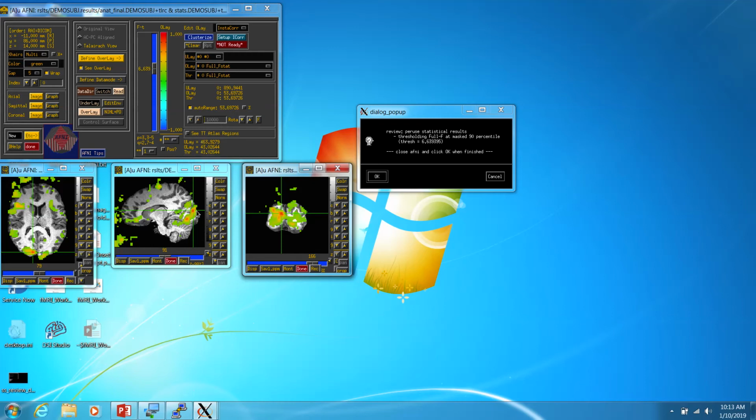And so our epi data is in our overlay. So OLay here corresponds, at this particular voxel, the F value is 43.02. There isn't a ton to evaluate in here other than you want your peak to be pretty high, basically as high as you can get it, such that your data allows it. And you want this peak to be happening somewhere in the brain.